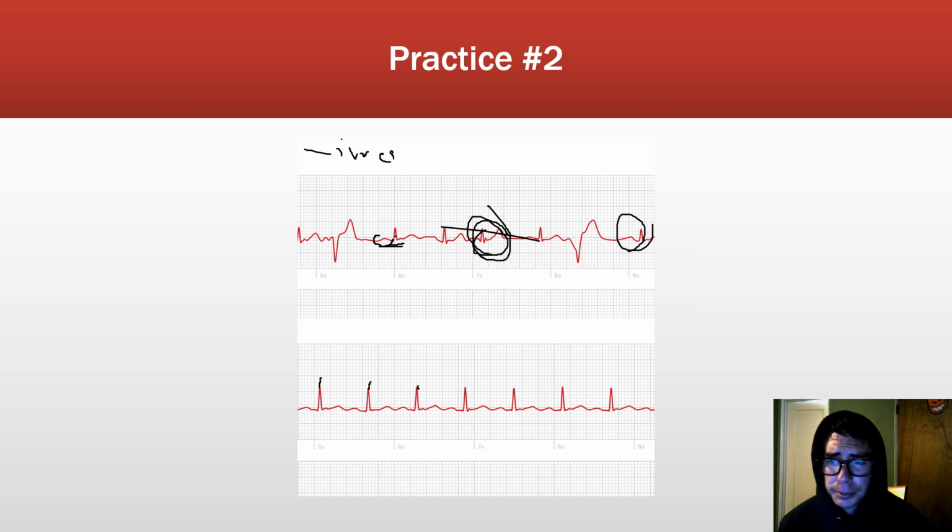So this would be what we would call either sinus bradycardia or sinus arrhythmia, because it's irregular maybe, but just because of the rate, that actually tells me that this one in here was actually another ectopic beat from the atria. And you'll know all this by the time we're done with this course. But down here, these look pretty regular as well.